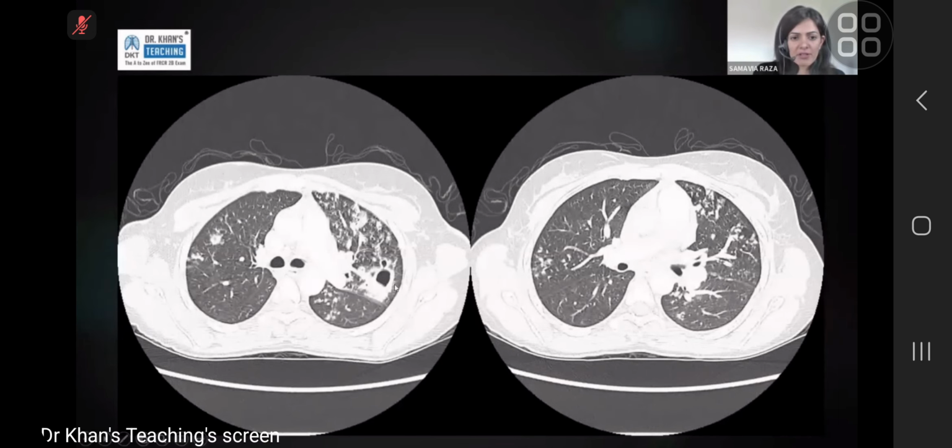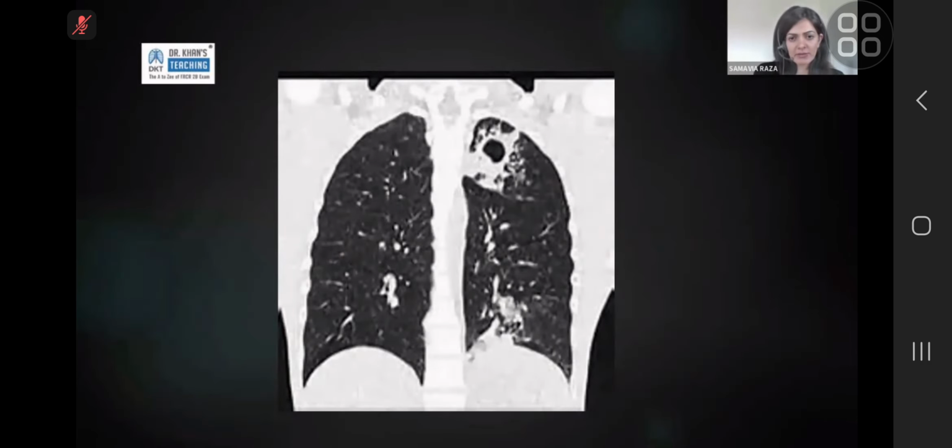CT for the same patient showing bilateral nodularity, tree and bud nodules, consolidation with associated cavitation in the left. So yeah, very, very suggestive of atypical infection, mycobacterium, in this case proven to be tuberculosis. If this was put towards you and somebody asked you, well, this patient has TB, we would like to know after 10 months of treatment, are they still infectious or have they responded to treatment?